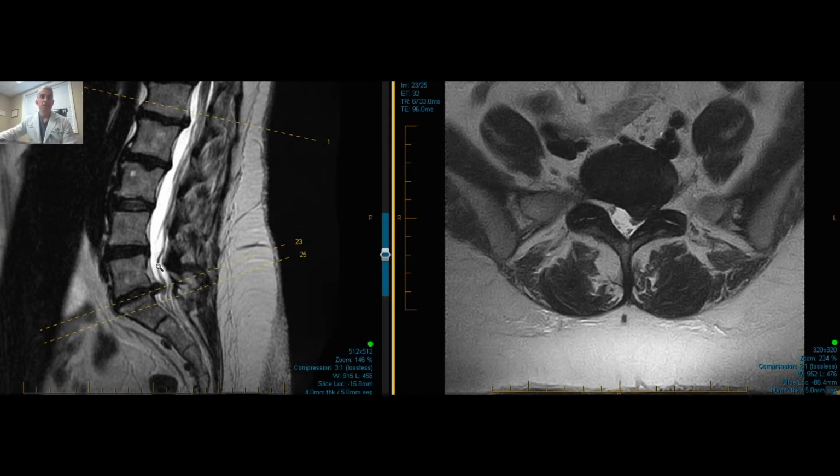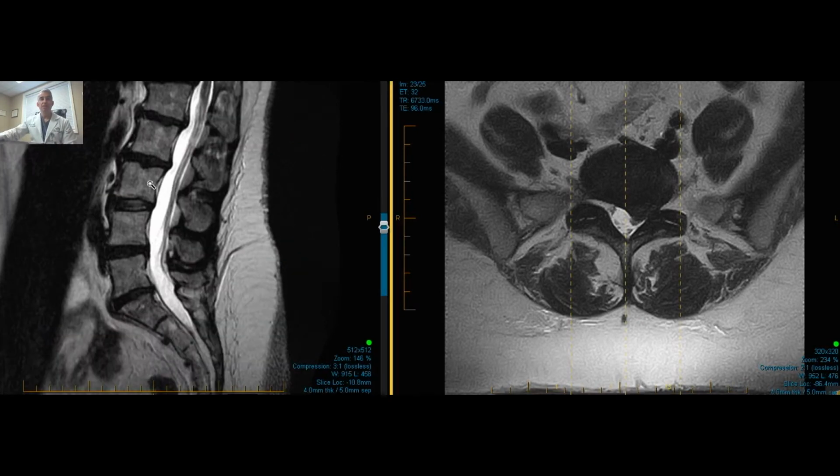What happens, though, as we age, you start to get these bulges in the sac, and you can see these little dents here. And that can be quite normal. If they got sizable enough, they'll start impinging on the nerves themselves. Now, when you look at this one here, you say, gosh, it's impinging because it's put a little dent, but it's really just in the spinal fluid. The nerves back here are really just fine. I don't really see any of these bulges touching the back. But let's go deeper into this, since we're talking about herniated disc, and here's really the midline portion.